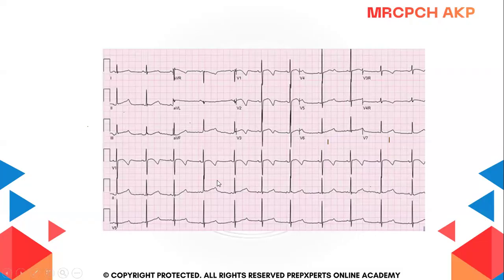So just have a look here. And I want you to always go through the long lead. Whenever you are reading an ECG in a hospital or anywhere in the clinic, just go through a long lead. It gives you a better idea. So you can see here that if it's greater than two big boxes, then you are going to say that it is a long QT.